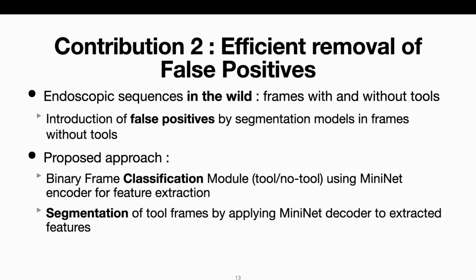Our second contribution is to develop a module to efficiently remove false positives. As previously shown, all models studied in this paper introduce false positives when used on images without tools. We develop a binary frame classification module to classify frames with and without tools.